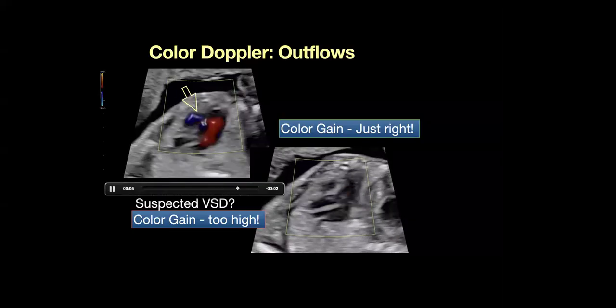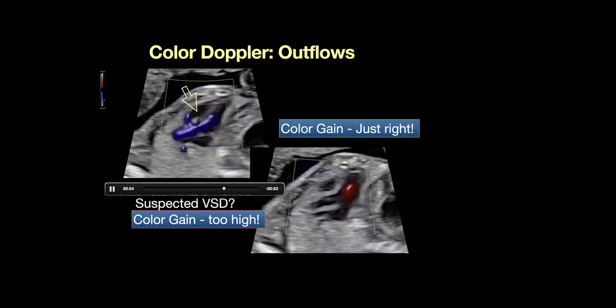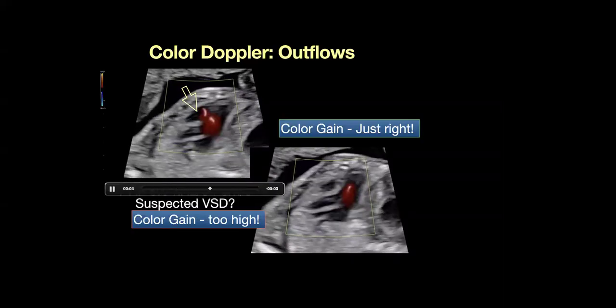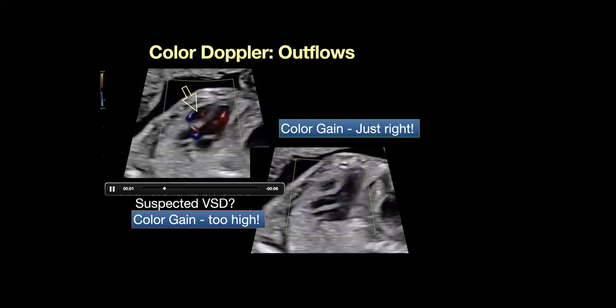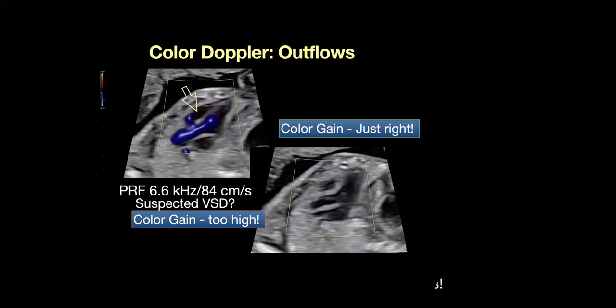The ultrasound industry is really trying their best to improve color Doppler image optimization. Many of their settings are really good, but at times you need to understand these manual manipulations, especially in a setting of a difficult case, especially with high BMI patients. How's the positioning? So really understanding this will help avoid these overcalls.